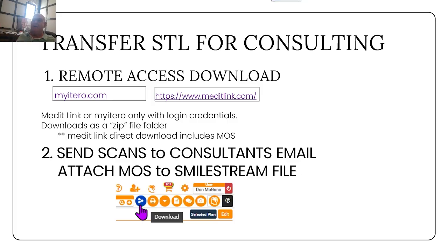Now let's talk about transferring the STL file, the scan, and Medit Orthodontic Suite to have a consultant work on the file for you. The easiest way for a consultant is to have your login information, which you can use with iTero or Medit Link. Those are the only two. The rest of them, my understanding is, you cannot remote into those computers to view or download a scan, but those two you can.